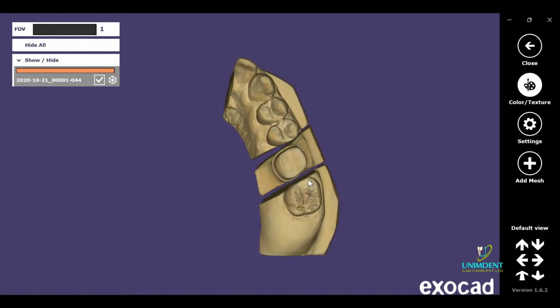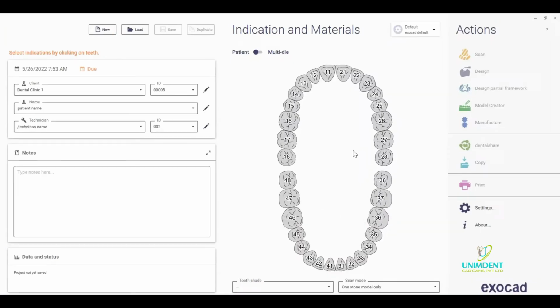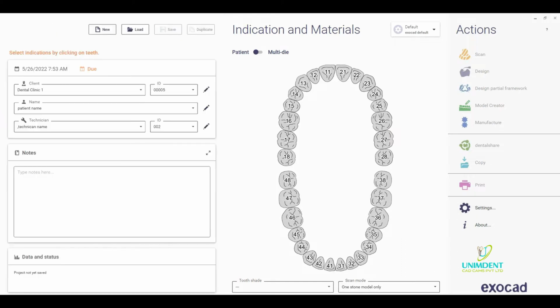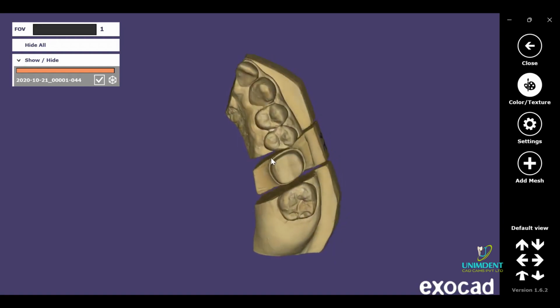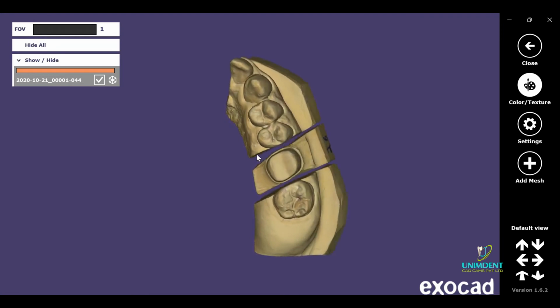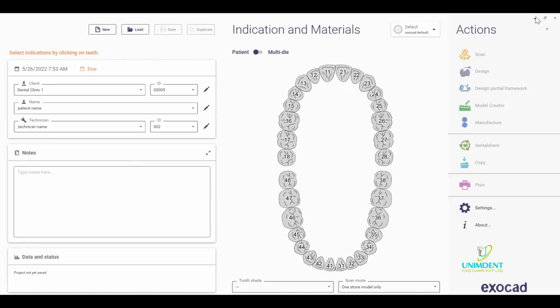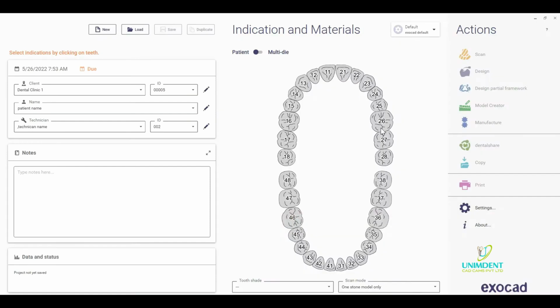This is the number of teeth of tooth. Okay, so we'll begin to choose it. There is something I want to explain. We must make the position of the model like the position of the teeth in this image. So for example, this is correct. Why? Because that is the same as the image.